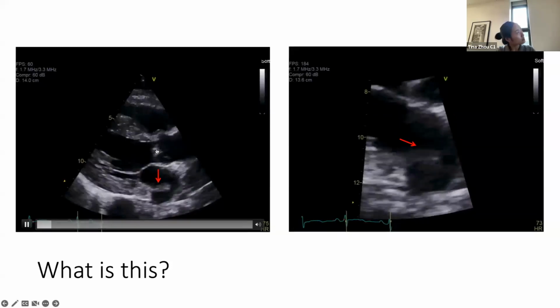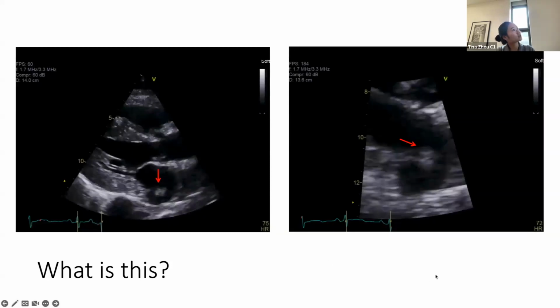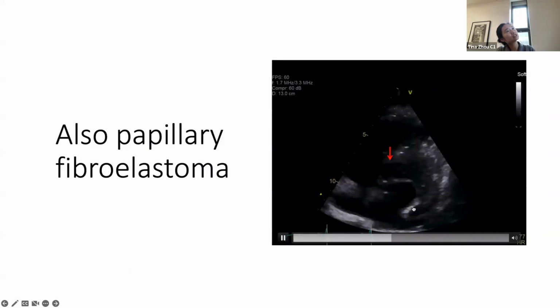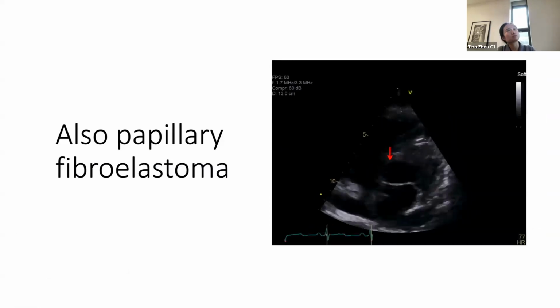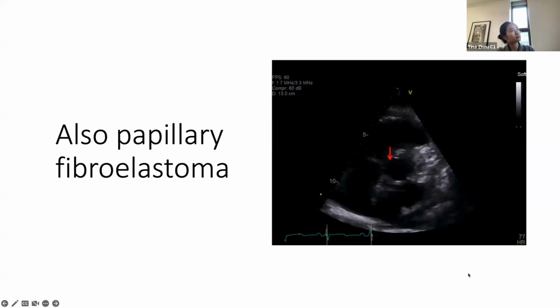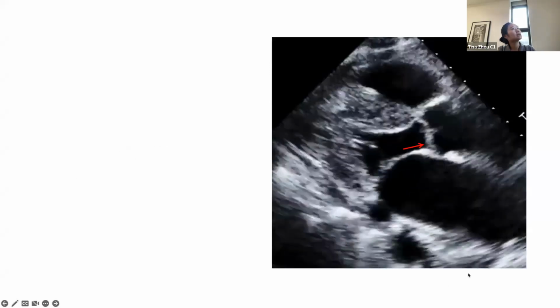There's also the echogenicity over here in the aortic valve, and in this slightly off-axis short axis view, you can see that right here, which, given it's the right atrium, almost looks like Coumadin ridge in this picture, but maybe not the right location. And 2 of the 3 aortic cusps also appear to have something on them. But these are actually papillary fibroelastoma.